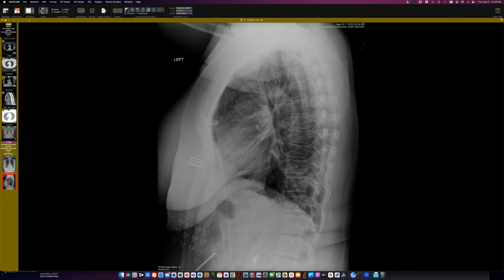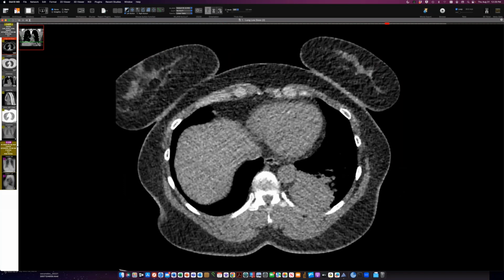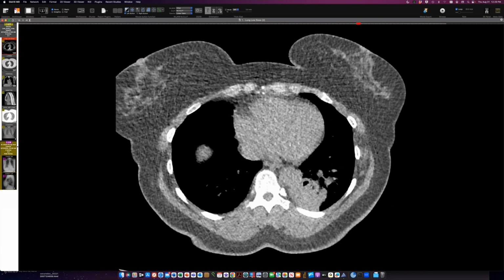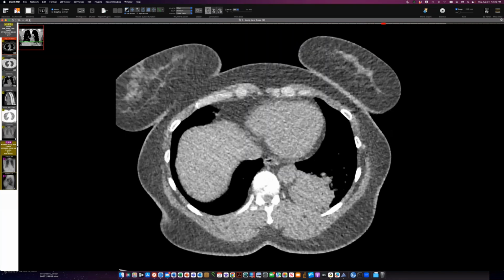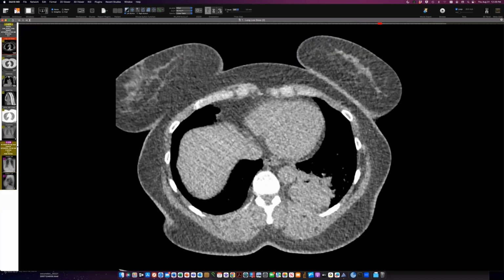So this woman was treated for infection, and this lesion persisted, and she had a CT scan. Again, this is all outside with this stuff in her left lower lobe, some airways getting into it. And then she got a PET scan, and it lit up a little bit around the edges, but not a whole lot. So it did light up some, even I think a month out from her initial infection. And then she got a needle biopsy.